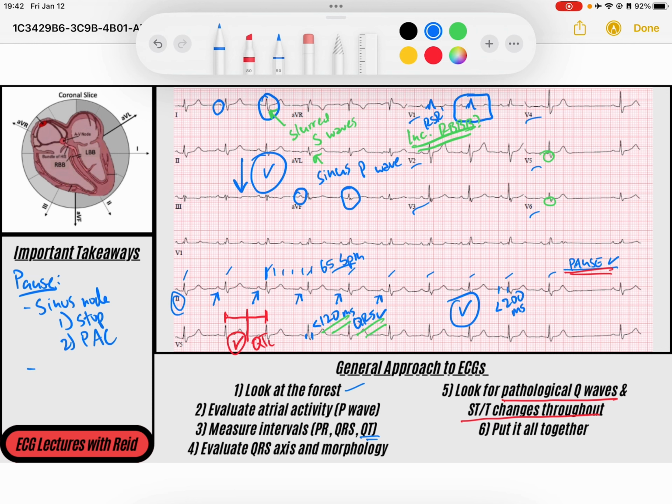Or are we, say, having an AV node issue, right, where we're not conducting signal down to the ventricles? So we could have a premature atrial contraction that is blocked by the AV node. So we could have AV blocks, just general AV blocks. And that's just the first thing that comes to my mind, especially when we already have identified this as a sinus rhythm. What about the underlying sinus rhythm is not going to work for this one beat? It's only just one beat, and there's no pattern to it.